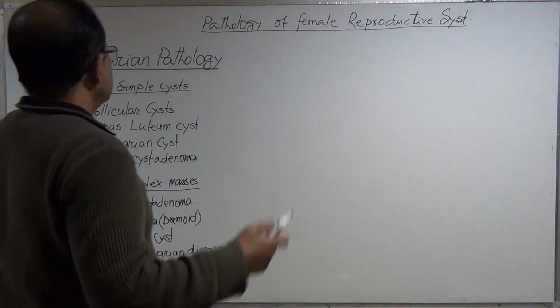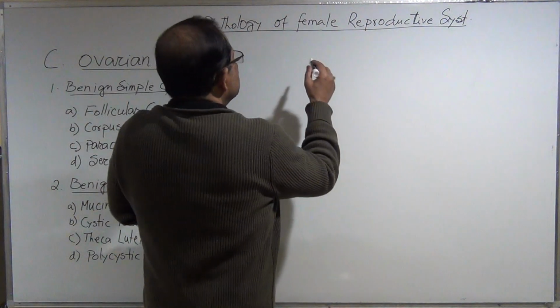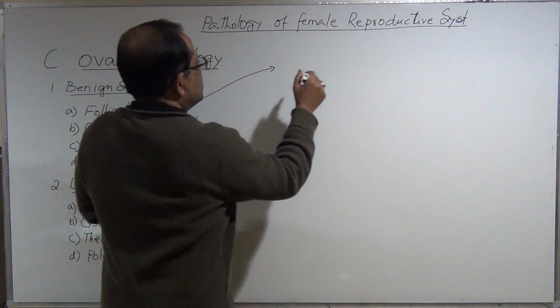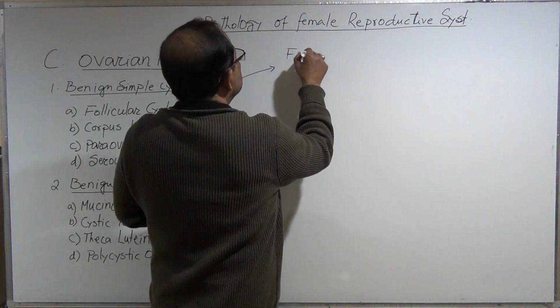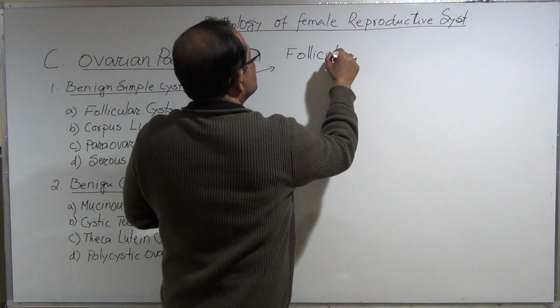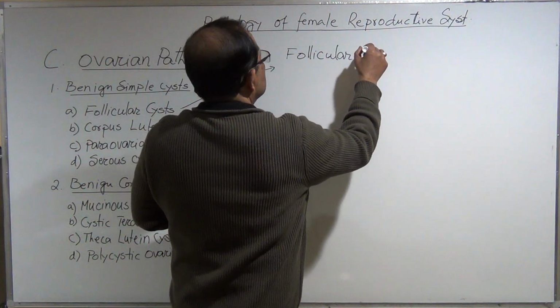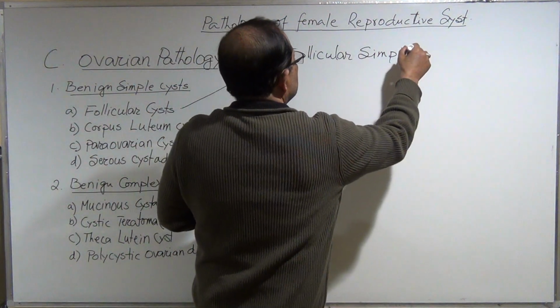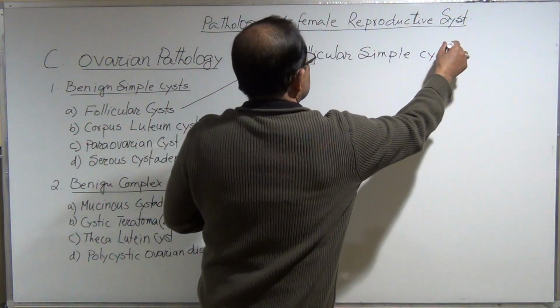Okay, follicular cyst. So I'm talking about the follicular simple cyst.